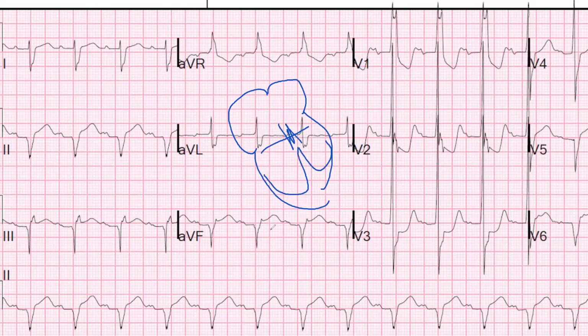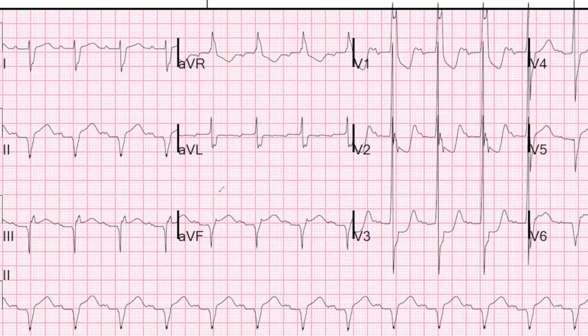Intraventricularly, we have two bundles. This is why we have two. You should revise the AV block. Every P followed by QRS, but it's longer, that's first degree AV block. Okay, next one, we finished the AVs.